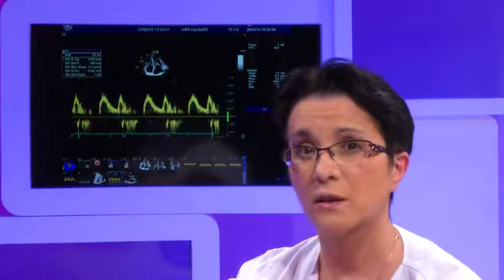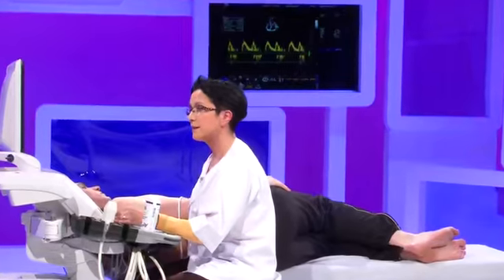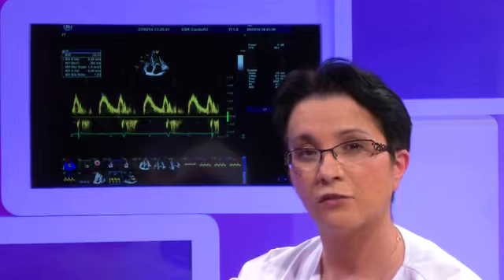Of course, this is a caricatural case of cardiac amyloidosis, the one that we see in end stage of the disease. One of the challenges of cardiologists in team with hematologists when they have to diagnose the cardiac involvement in amyloidosis is to find the disease in very early stages. Several studies have shown that before systolic dysfunction by conventional parameters or diastolic dysfunction occurs, the first parameter that can show early LV involvement in amyloidosis is still myocardial deformation using tissue Doppler imaging or speckle tracking.